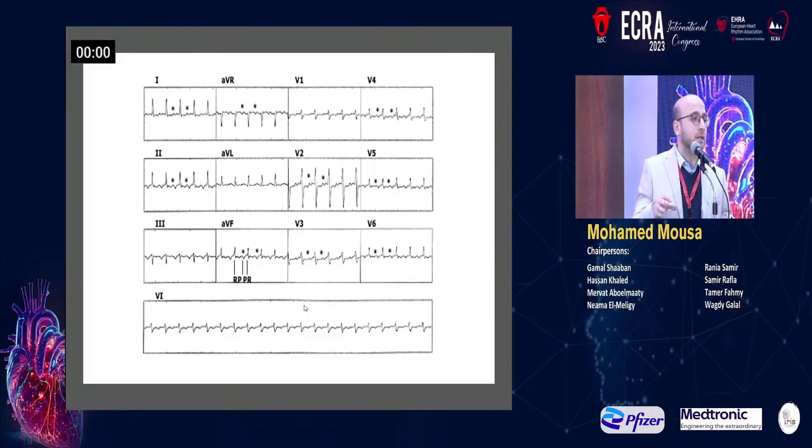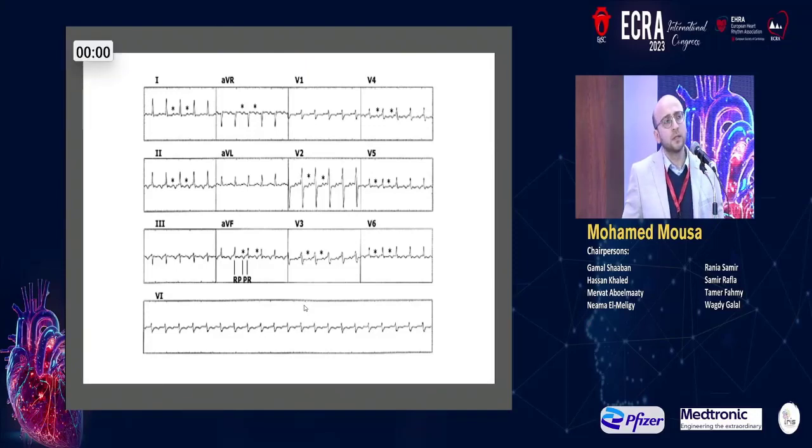What I'm saying is, the characteristic morphology of the P wave, negative in the inferior leads 2, 3 and aVF, usually indicates that the direction of activation is from below upwards. So a coronary sinus atrial tachycardia or atypical AVNRT, and all of them are ablated from the coronary sinus ostium. It's almost the same. The people writing UpToDate are not always electrophysiologists.